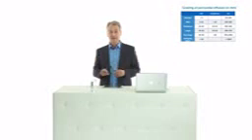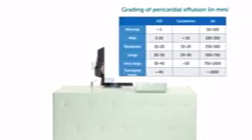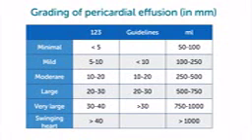If you have more fluid, then we would have an echo-free space in diastole. And this is the actual definition of a pericardial effusion. And that's also where we measure the pericardial effusion. And this scale I have here on the screen shows you how to grade pericardial effusions according to the societies here on the right.